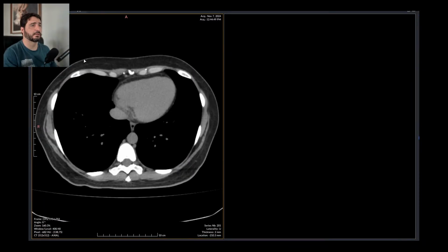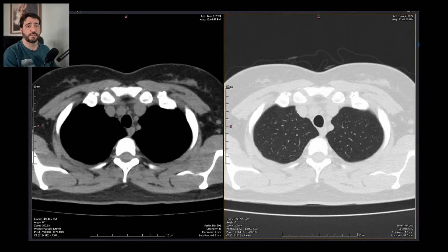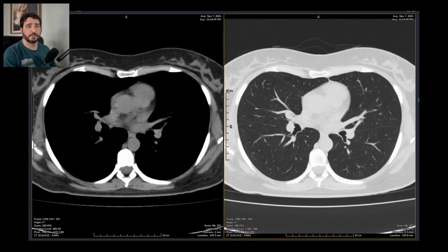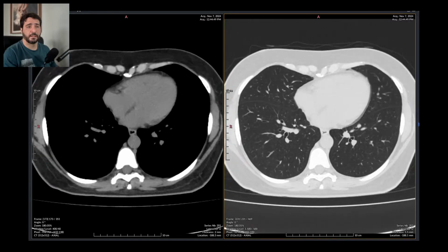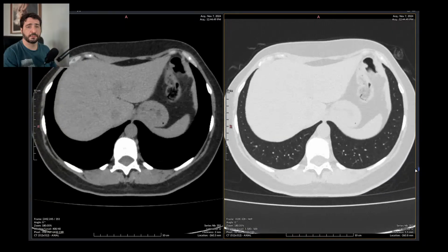It's a 48-year-old female patient. Let's see what she has here. It says she smokes, so it's a CT scan because the patient smokes. Okay, I can deal with that. That's enough for me. It's better than knowing nothing, really. If the patient smokes, it's usually a good clinical feature to be aware of.